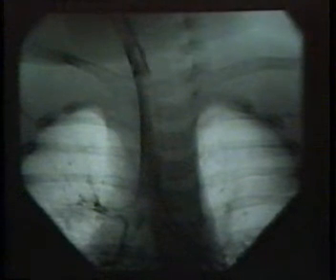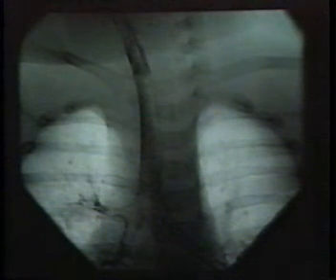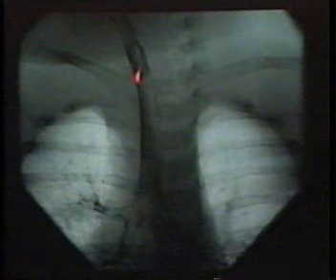And yet the bronchoscopist described near complete narrowing of the trachea under direct visualization. Well, what's happening here? The positive pressure is distending the trachea, and I am missing the anterior compression. Be aware if you do tracheograms that the patient must completely be at rest and that you can't have your endotracheal tube down to here. This tracheogram was normal despite the presence of rather severe compression on bronchoscopy.